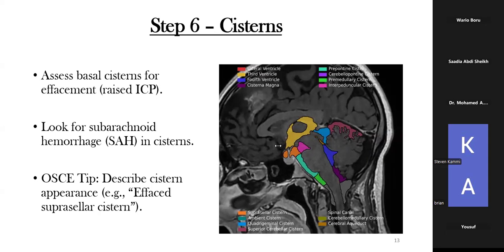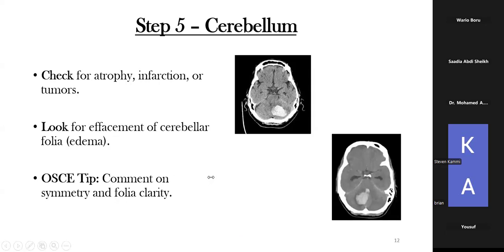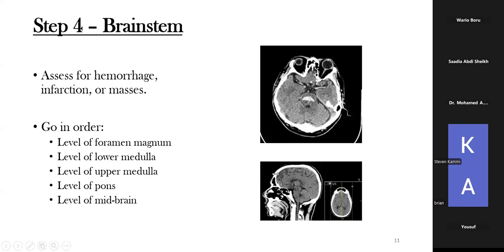But in a CT scan, look at this, like look at the sagittal images that I'm posting. I'll show you, look at this one. You see here, this is soft tissue, but you can see the skull base coming like that. You can even see the brightness or how white this one is and how white this one is. There's definitely a difference between the two. I hope I've answered that.